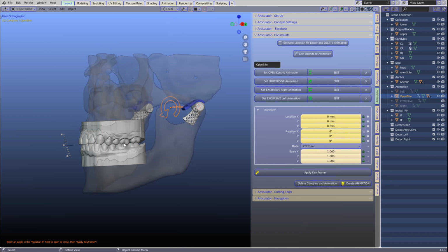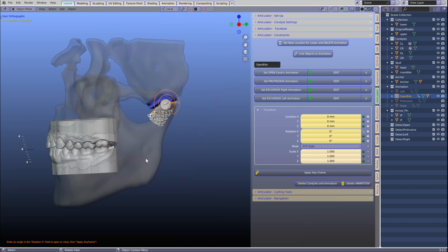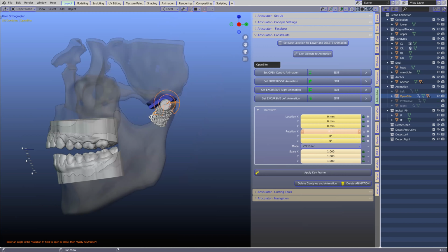So where do you want to set to 3 millimeters, on the articulator pin or the back tooth, 3 millimeters down? Because as we're moving the entire mandible, okay, 3 mils, and then so it's like so down, and that's it.